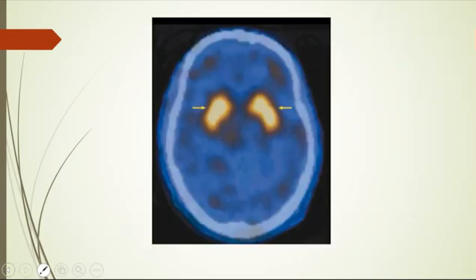So, what's going on here? What's the exam exactly? PET CT. Do you think this is PET? This is not a PET. This is SPECT. Okay.